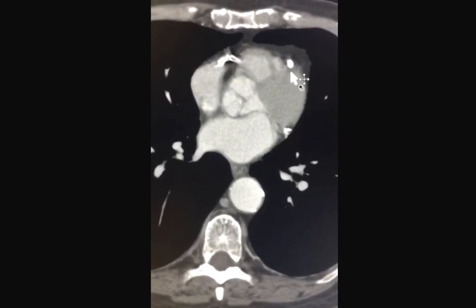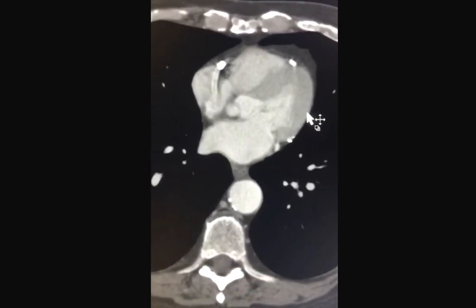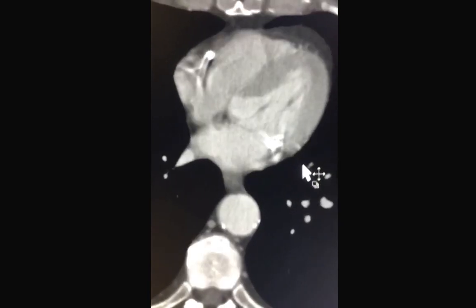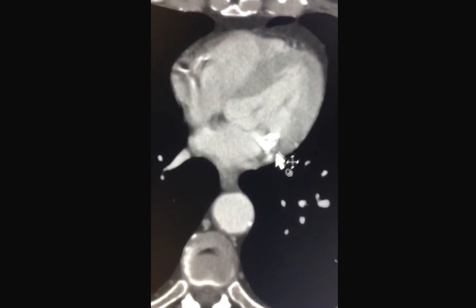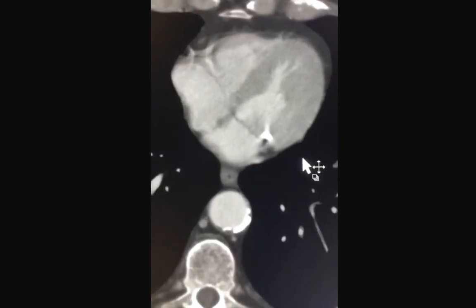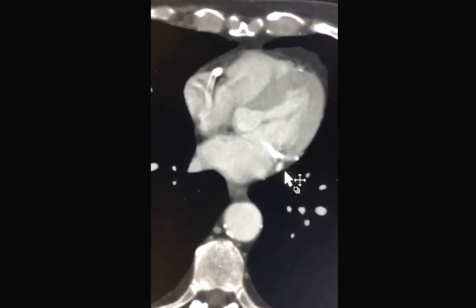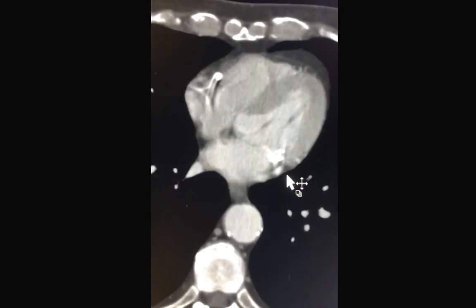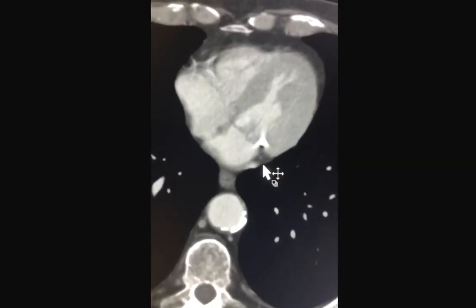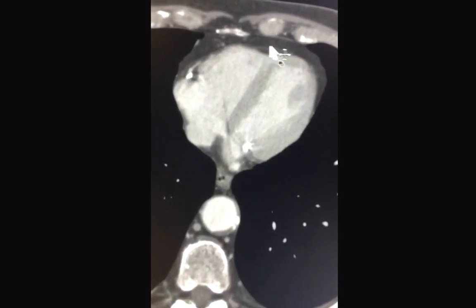The patient does have coronary arterial calcifications which are difficult to appreciate on the chest radiograph. The area that we were interested in, based on what we saw on the chest x-ray, is this region here. Note how this chunk of calcium here is separated from the adjacent coronary artery, namely the left circumflex coronary artery. Also notice that this calcium does not involve the pericardium, which is thin and seen with difficulty in this case. That's the normal pericardial appearance.